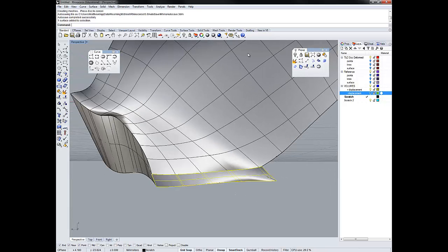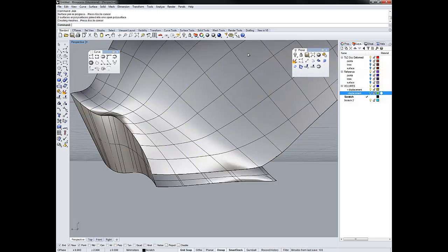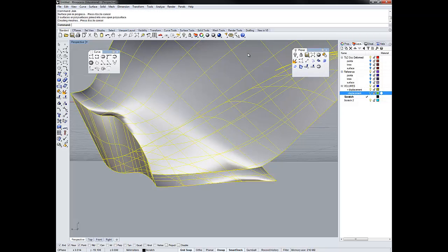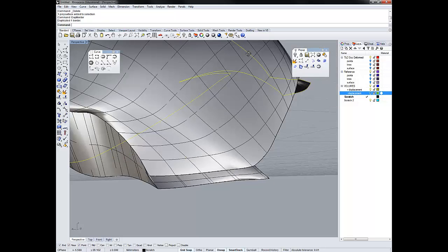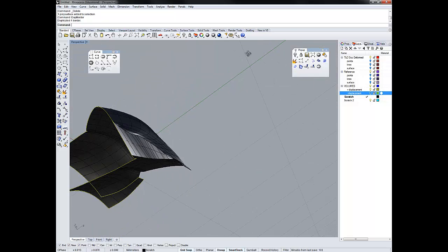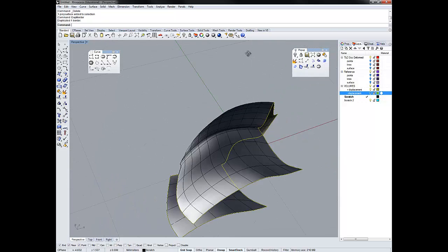So let's do this again. So select our surface, select our building volume, type join, and now we're going to duplicate the borders. Actually, we're going to invert first. Invert, delete our reference geometry. Now we're going to duplicate the borders. And so we notice we do not see a line here, which means that it's closed. That's good.